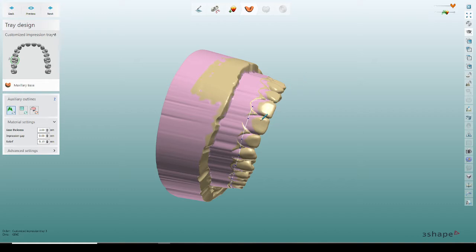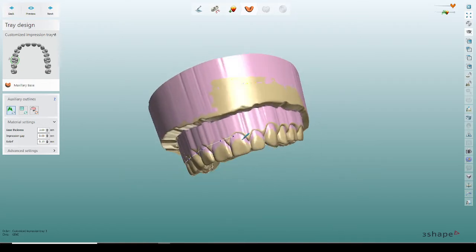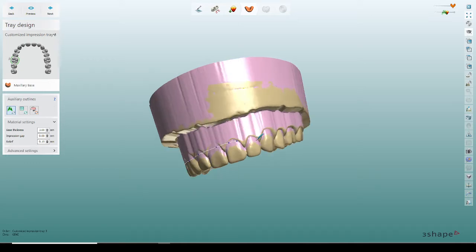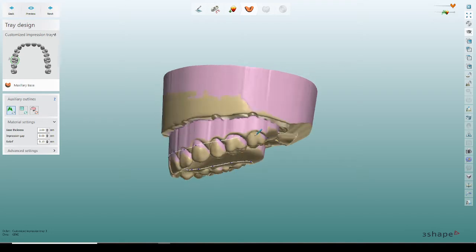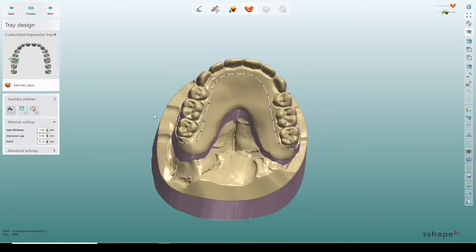Just so you guys understand, once the cage is done, that space is going to be open right there. So when you position the teeth, just view the things on the palatal. That's where your best adaptation is. You can make it shorter if you wanted to, but I'd rather do it this way, and this allows me to put a little bit of wax there to grab things a little bit better and hold them in place. That's just kind of my way of doing things. But if you don't like to do that, you guys can change it any which way you want. So that's at 3 millimeters.